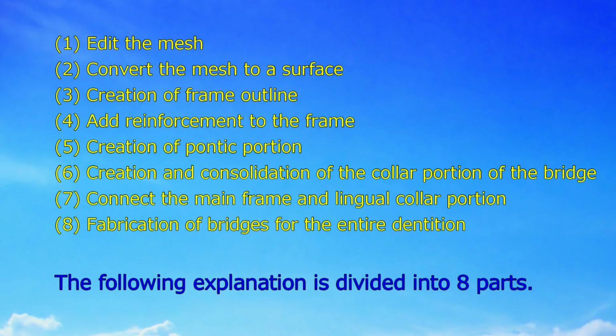1. Edit the mesh. 2. Convert the mesh to a surface. 3. Creation of frame outline. 4. Add reinforcement to the frame. 5. Creation of pontic portion. 6. Creation and consolidation of the collar portion of the bridge. 7. Connect the main frame and lingual collar portion. 8. Fabrication of bridges for the entire dentition.